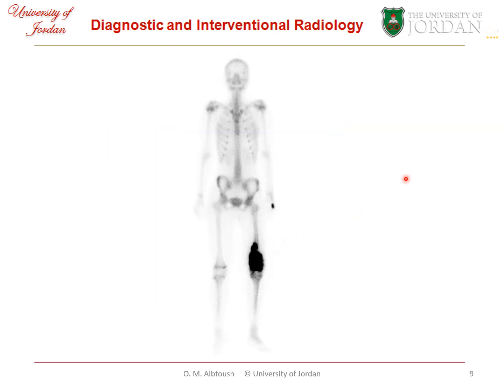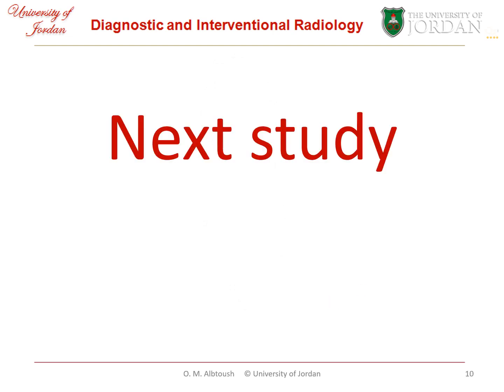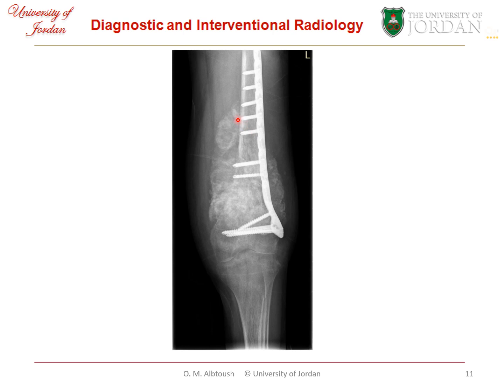So the patient still complained. A bone scan was done and showed intense uptake in the left distal femur. A follow-up scan showed a heavily calcified mass at the site of the fracture, with a multi-lobulated appearance, and it had progressed in size compared to the previous study. So, as you can expect, this case is a malignant process on top of the fractured bone.